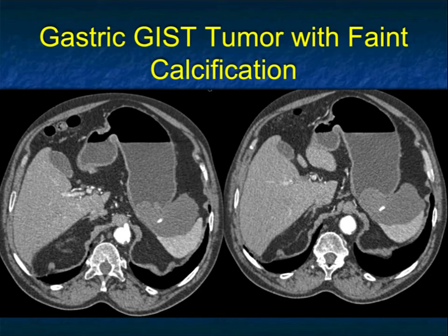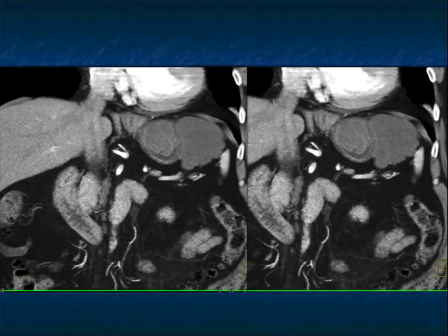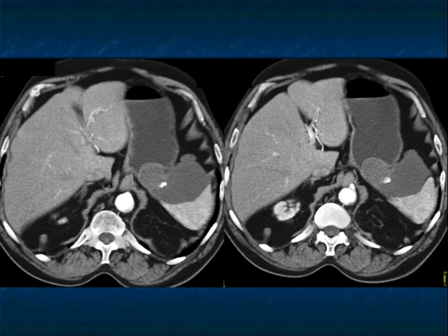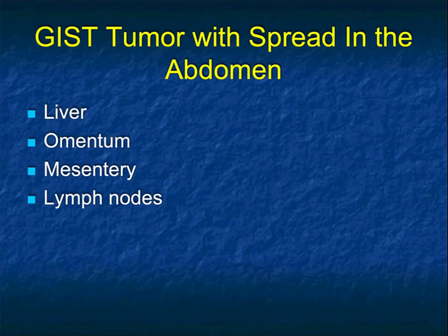And here's one more of a GIST tumor, again, with just some faint calcification. This helps you a little bit. There aren't that many tumors that calcify. Again, if you're worried about pancreas, it can calcify, neuroendocrine tumors especially, SPEN tumors, MCN, serous cystadenomas. But the lesion here is really coming off the stomach, so I don't think you're going to have the same difficulty in a differential diagnosis. And just a few more views of that case, very nicely shown.